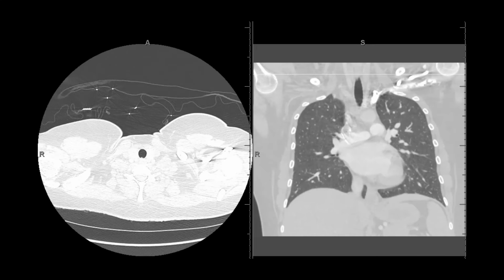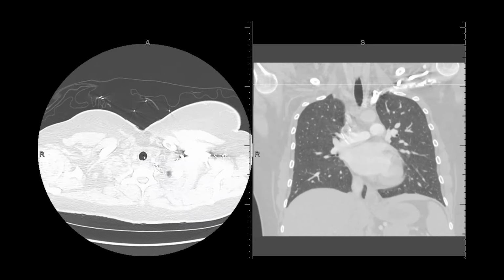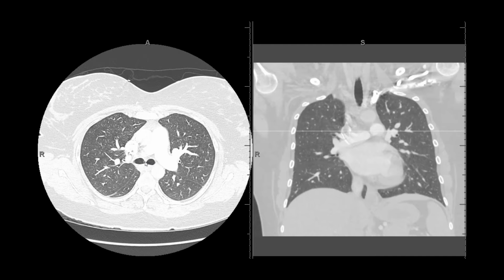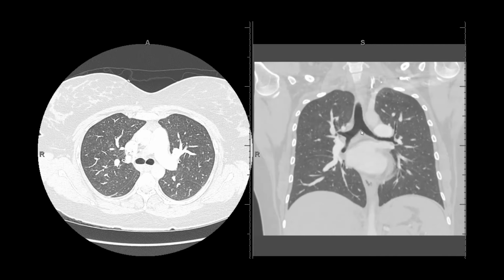Next, let's cover the lungs and the airway. All the air goes from the top through the trachea, and the trachea extends inferiorly into the chest, and it's going to split. Where it splits, this anatomic point is called the carina, the split of the trachea into a right and a left main stem bronchi. So those are the pulmonary bronchus on each side.